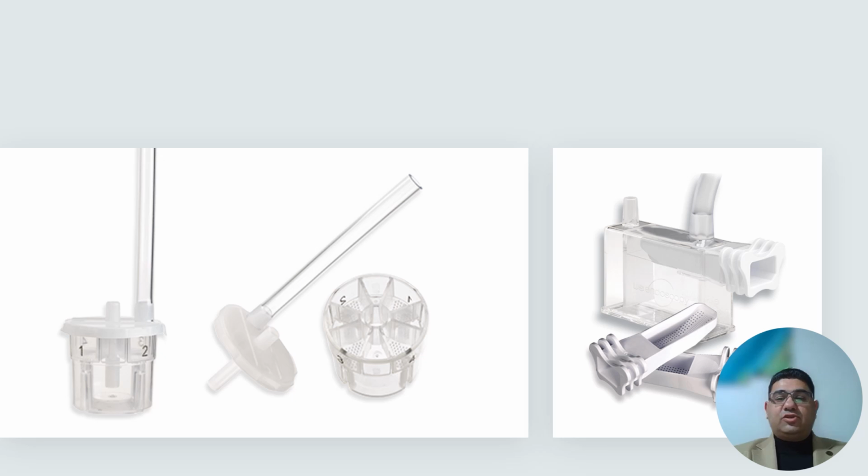These are examples of the polyp traps that we have. This one we can change, according to the position of the lesion or the characterization of the lesion. This one also is a polyp trap. We can move this part to have a first specimen, second specimen, third specimen, or fourth specimen.